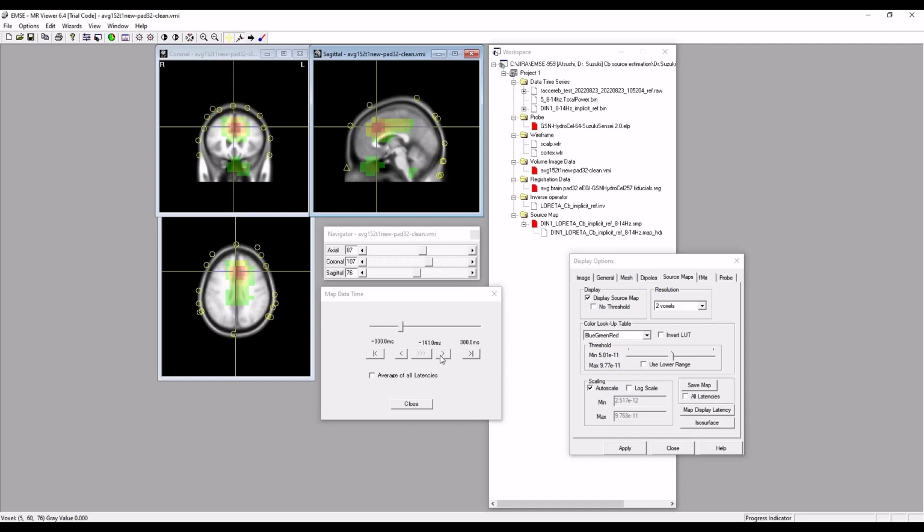We can play with that a little bit. It's not necessarily the maximum, but I accidentally hit this one. It took me all the way to the end. Here we are again. So something in this time range, in about the -140 or so time range.